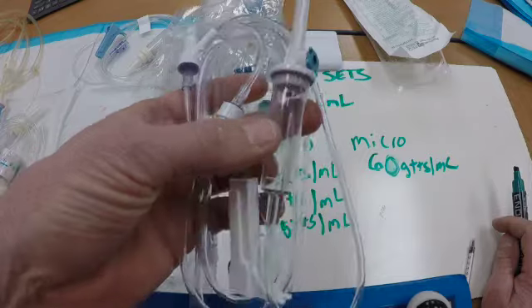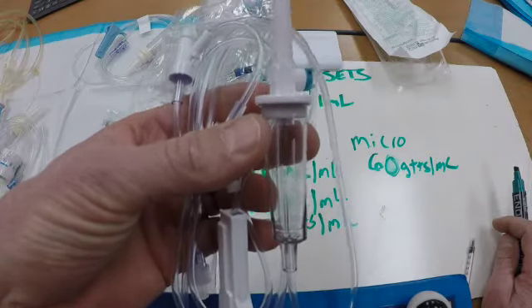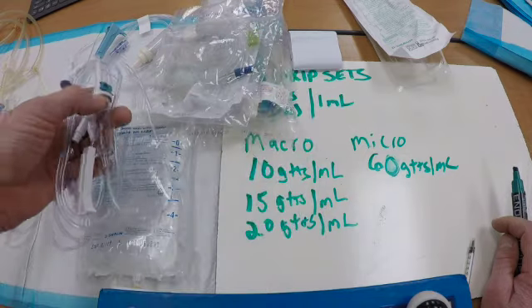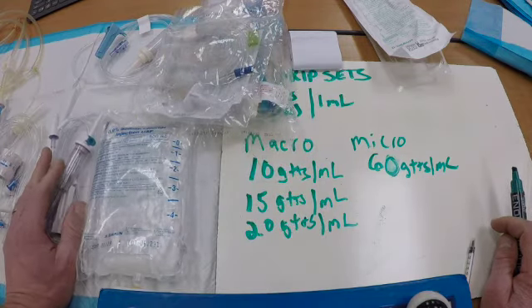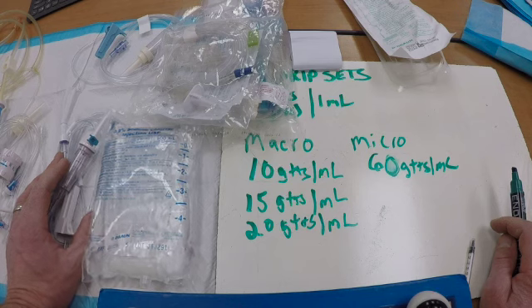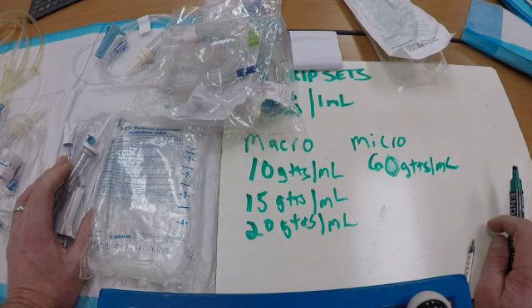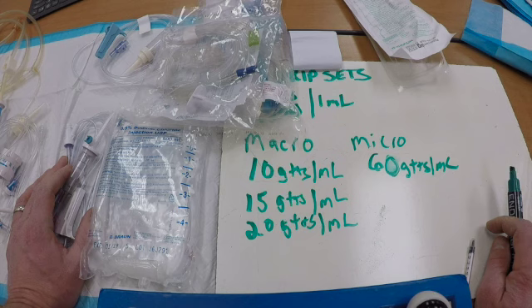So if you have the micro drip set, you set this down, maybe you open 2, the one with the needle is the micro drip set. And the micro drip set is almost always used for infusing medications where we need to be very precise and accurate over a fixed amount of time. More and more agencies are going to pumps, which is great, but yours may not, or the pump might break, so you may still need to count the drops and do the medication infusion.